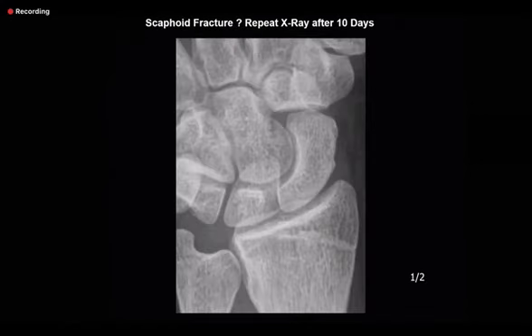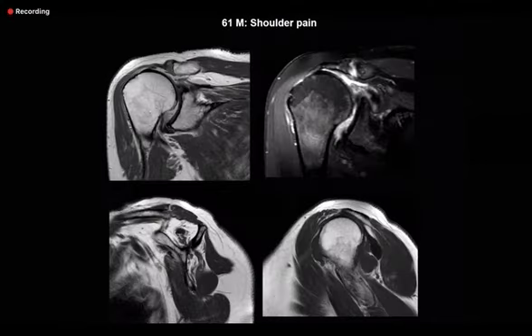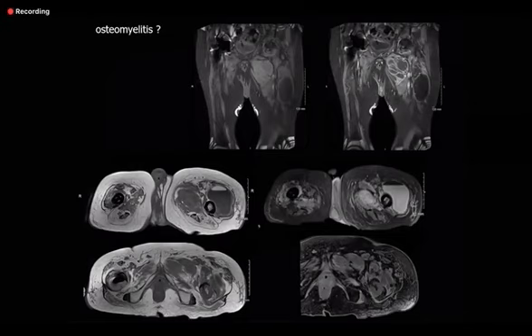The last case for you will be a PACS type case. In this case, I am going to just ask you a question. There is a lot of abscess formation here, and there is a fluid level. Compare it with this one.